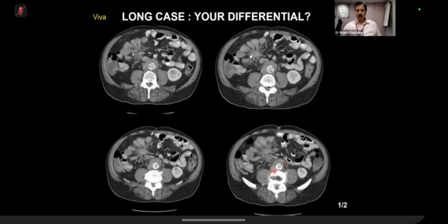This soft tissue there is basically retroperitoneal fibrosis. With that, there is sclerosing mesenteritis. Please remember the spectrum. The case which I showed you initially is more acute, but gradually there can be fibrosis and there can be calcification there. So calcification with surrounding soft tissue within the mesentery, the top differential diagnosis include mesenteric panniculitis or IgG4 related disease, which will be slightly more chronic.